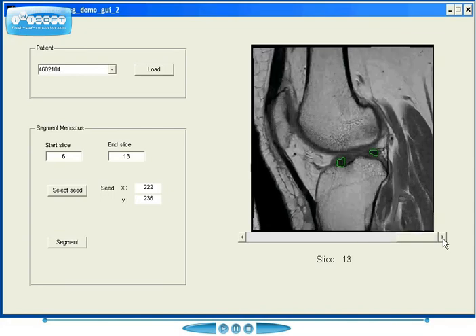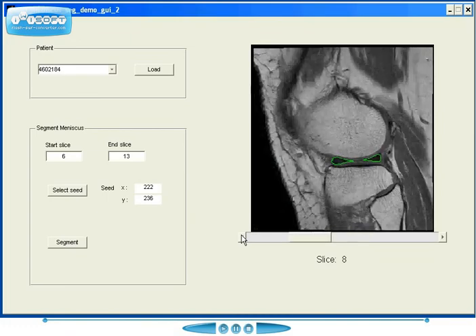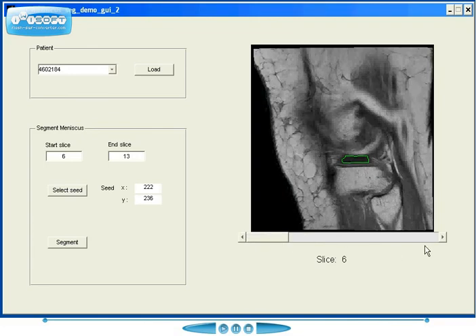Some of the uses for this algorithm could be to track osteoarthritis structural changes with osteoarthritis clinical symptoms. The meniscus has been shown to have a role in biomechanics of the knee joint, and removal or injury of the meniscus predisposes to early onset of osteoarthritis. Segmentations are the first step to being able to extract volume, intensity distribution statistics, and texture analysis to find a potential biomarker for osteoarthritis.